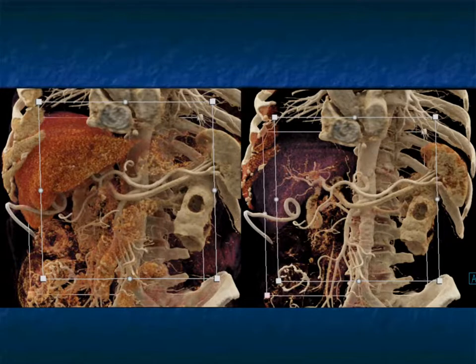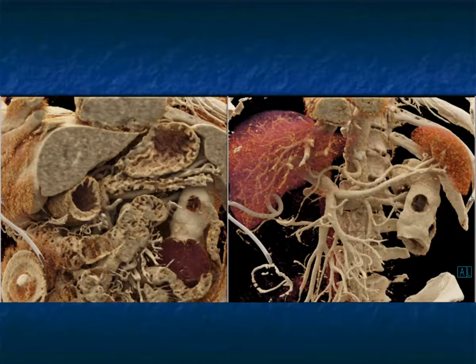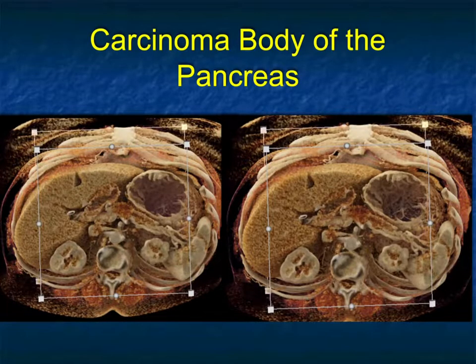Here I'm showing you optimally the patient's arterial structure, celiac and SMA, as well as the splenic vein and portal vein. Now from below, I'm bringing in the pancreatic glandular texture, and I'm looking at that, and I'm looking here at the dilated pancreatic duct. These are the same rendering volumes, but it's how we show the information that will vary. And you can see very nicely when I play with the texture a bit, there's the mass. It's much more obvious here.